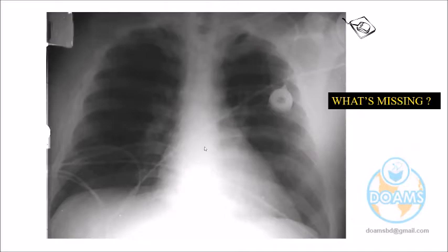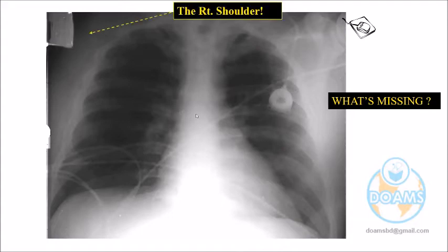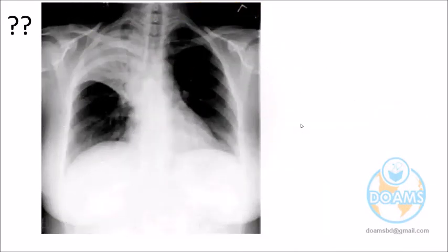Dr. Abdullah also. Clavicle not seen. Only clavicle or other not seen also. It may be clavicle going up here. But what is not seen? Here, shoulder and other. Yes, maybe. So the right shoulder, not visible. This is missing. Here, what is the diagnosis now? Come to the core topic. Everybody tell the diagnosis.